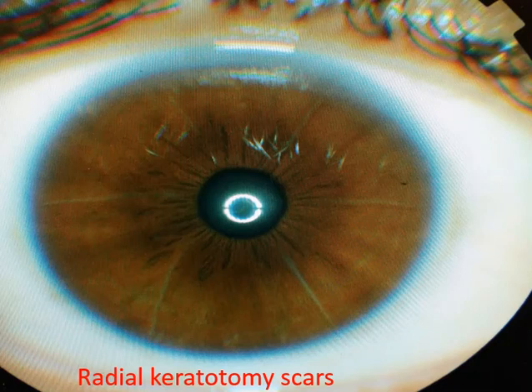Hi friends, let us try to understand this anterior segment image. This is an image showing some white lines at different meridians on the cornea. This is not an infection because there is no redness or any sign of inflammation in the conjunctiva or in the sclera.